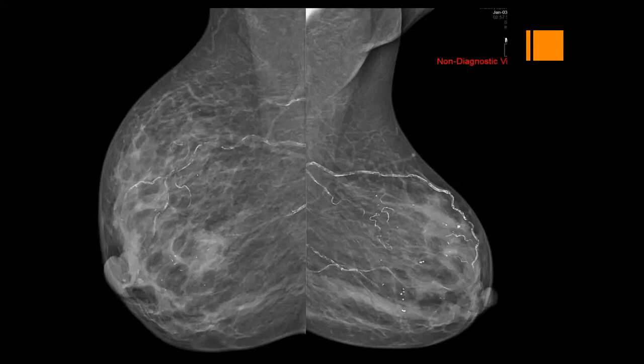Good observation. What else? There is an abnormal calcification, different from the typical benign calcification you have seen on mammogram. You need to do spot magnification for that area to characterize it further. Okay, excellent, well done. Excellent, good observation.